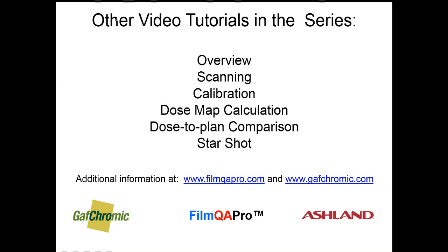This concludes the tutorial on scanning. Other tutorials are available to fully explain dose calibration, dose map calculation, dose to plan comparison, as well as tools for machine QA analysis.